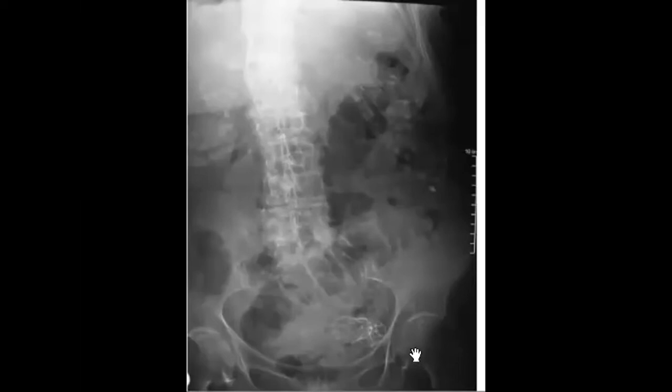And if you find small bowel dilatation, you will search for large bowel dilatation. So there is no large bowel dilatation. You should characterize that it is small bowel; it's not enough to just mention that the bowel is dilated. So the dilated loops are small bowel, and the large bowel loops are not dilated in this case.